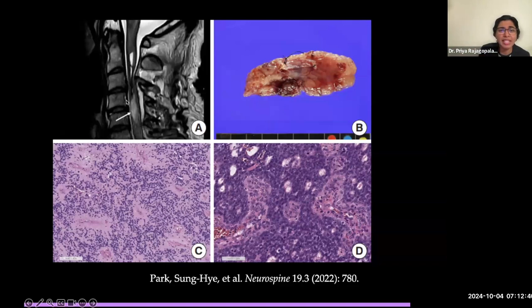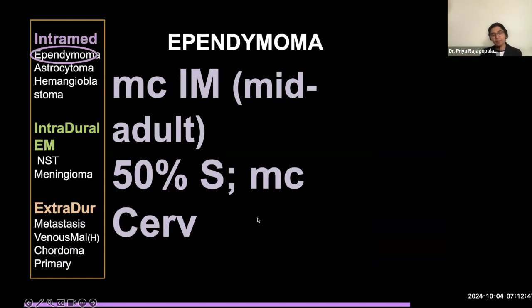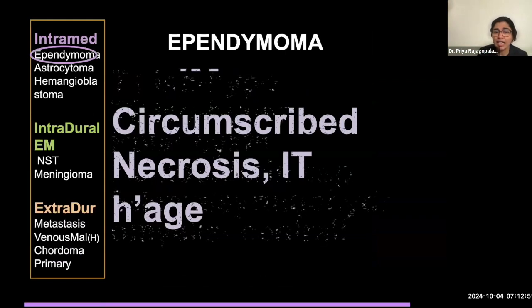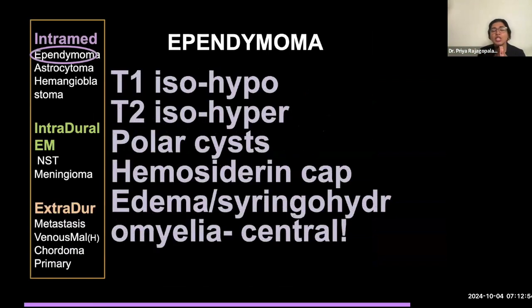And here's that expansile appearance with that edema. This is that resected ependymoma, and here's the histopathological evaluation of it. Now, ependymomas, like I said, are pretty circumscribed. So when you look on an MRI, how does it appear? On an MRI, because of the water content of it, it's slightly brighter on T2. And then these tend to have the polar cysts, meaning these little trapped CSF collections typically happen at the poles of the tumor.